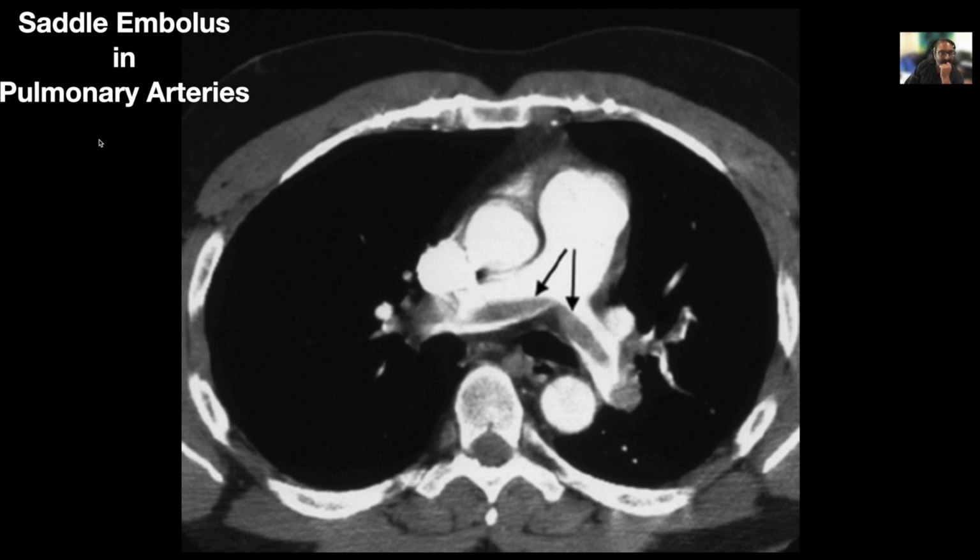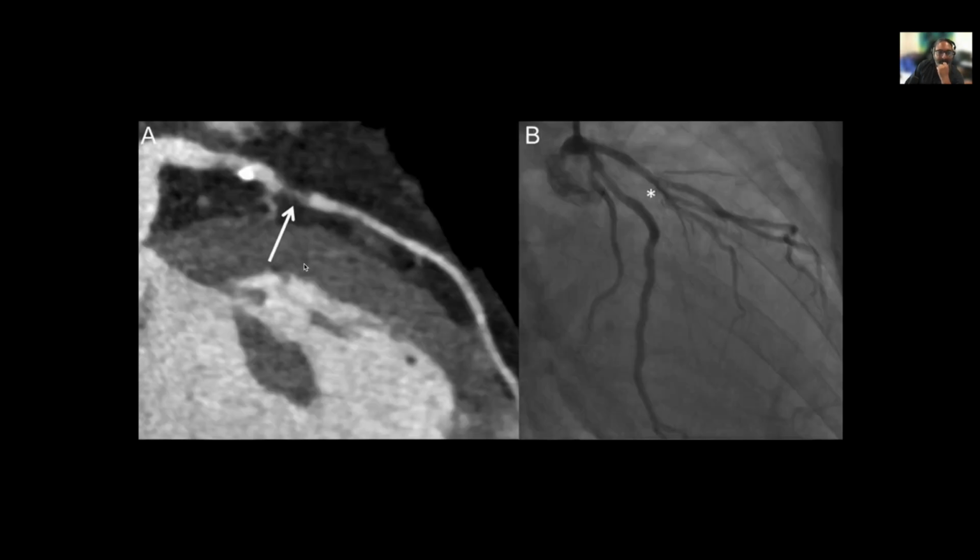All right. This is actually not a CT. Oh, you actually can see this on CT. That's not a CT, that's an angiography. That's an angiogram. But that's a CT. So you see something. If we're looking anteriorly at the heart, it's probably more likely to be the left circumflex, is it? It could be. I actually cannot tell which artery this is. No, you can't, not from this view. You're right.